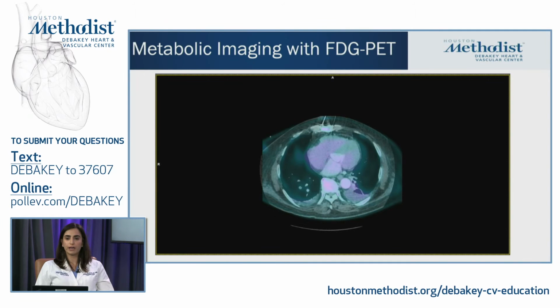More so, we calculate what we call the SUV, the standardized uptake value of the FDG itself, and it was very high, around 5.7, which is very suggestive of inflammation. The Hounsfield units on CT of the areas in question were also around 30 to 35, which is also concerning for abscess in that region.